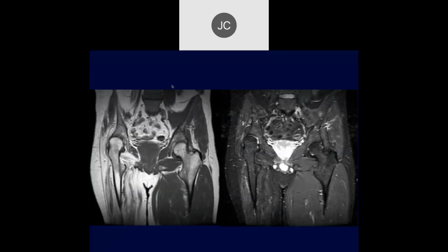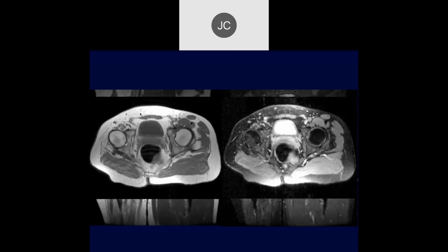Now that you know the answer, we were saying that there's asymmetric atrophy on the right, probably long-standing, and marked atrophy of the muscles. We've seen this before. This is very characteristic of polio. This is a characteristic deformity you can see in polio when it involves a child's muscles here, so they no longer get proper traction upon the femur. And here we can see the focal atrophy due to the denervation from polio.